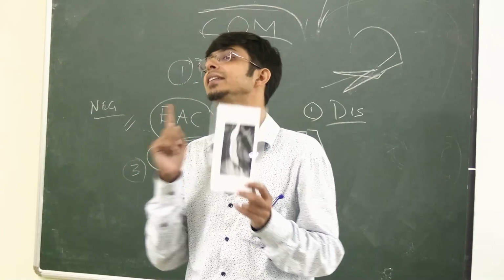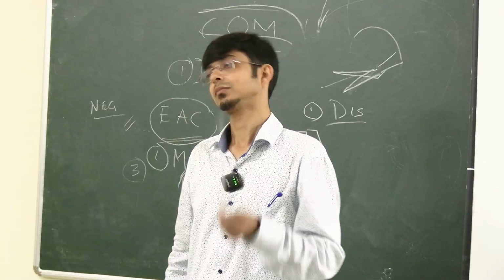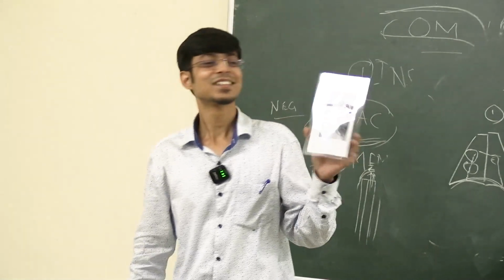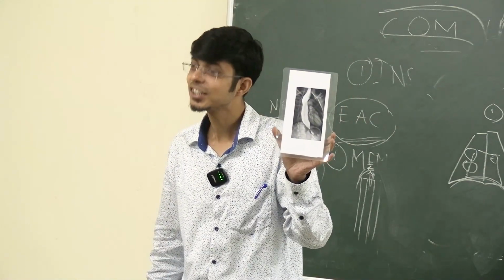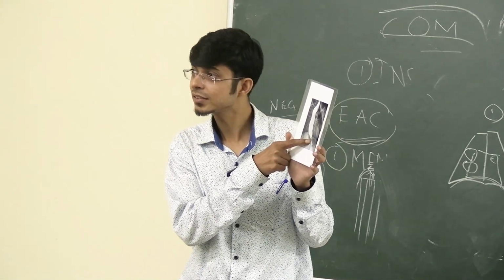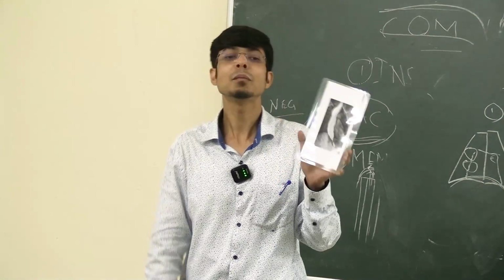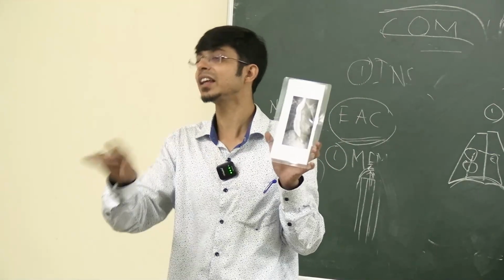Who told you this? You tell me, I'll correct you. First check the adenoid. So this is a barium swallow X-ray of the esophagus, showing an acute narrowing of the esophagus, lower esophagus. Okay, did you understand? Did you see the acute narrowing of the esophagus? Or a bird beak appearance. Most likely the diagnosis, this is a case of Achalasia Cardia.